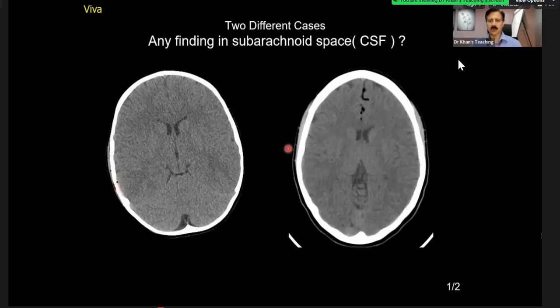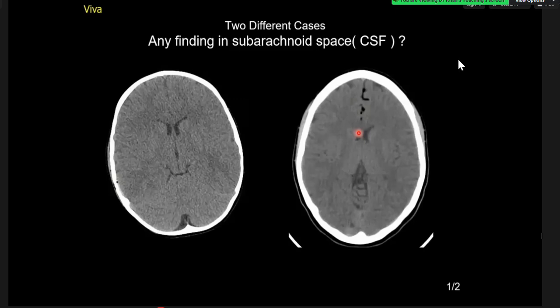How can you confirm this? Okay, what is this hypodensity? It's again most likely air, but fat can have the same kind of appearance. We'll have to go through. Excellent, excellent. So this is a ruptured dermoid, by the way, which is an exam case, and this is pneumocephalus.